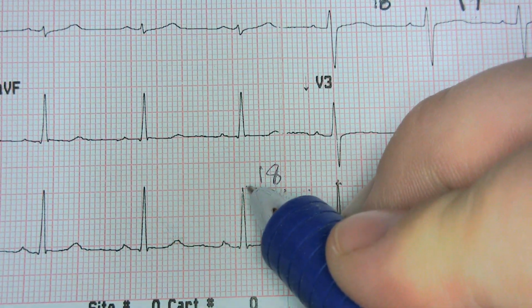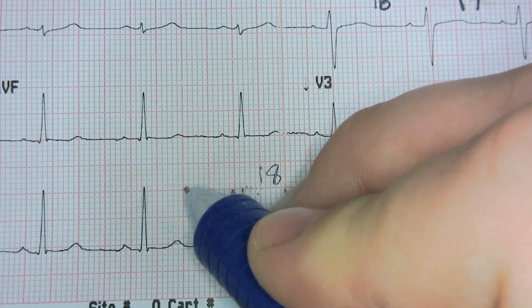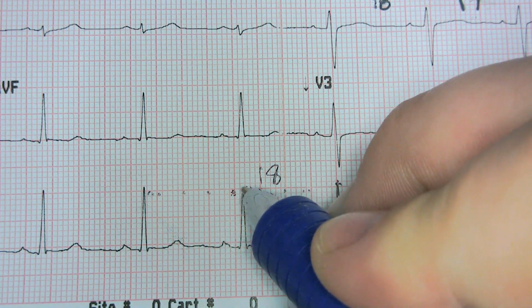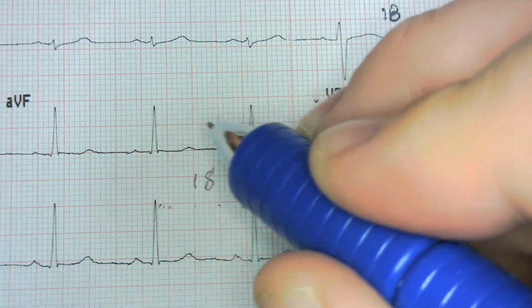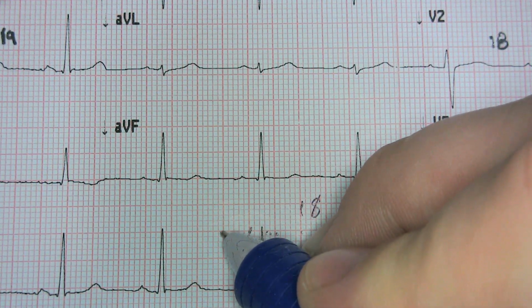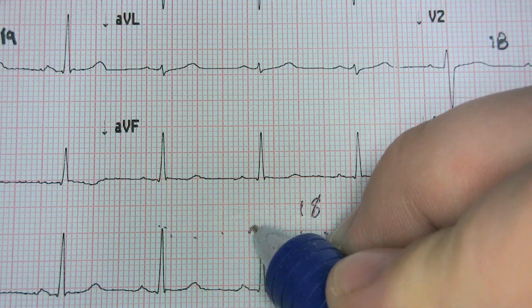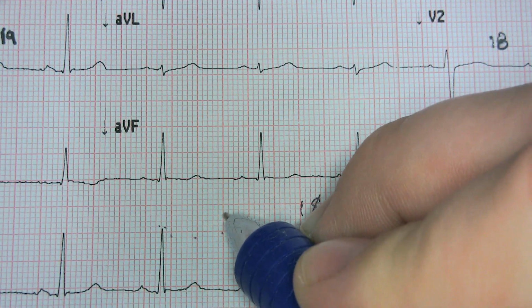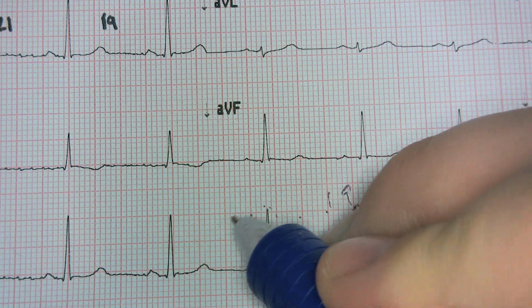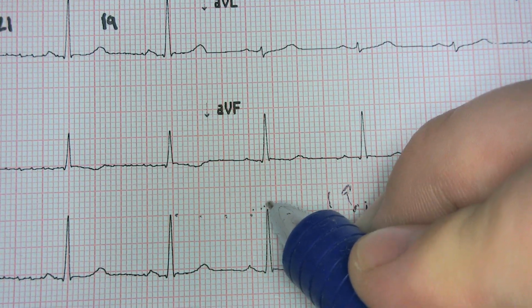Alright, so we're just going to start here for the sake of simplicity. 0, 5, 10, 15, 16, 17. Going back over here, 18. We're still at 18 little boxes. Make life easy, we'll just start here. 0, haven't got anywhere. 5, 10, 15, 16, 17. We didn't count a few over here. 18, 19. We're at 19 over here. Once again, 0, 5, 10, 15, 16, 17, 18.